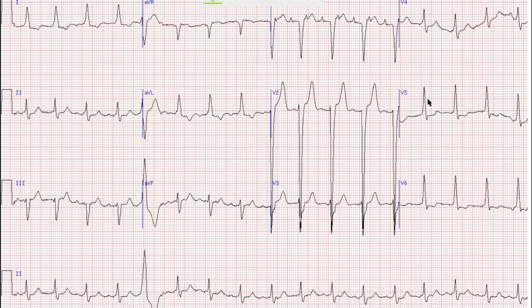As you know, the first thing which we look at on an ECG is rhythm. For rhythm, we look at lead 2 or rhythm strip. In lead 2 or rhythm strip, we can find upright P waves before QRS complex. So this is probably a sinus rhythm. Next is heart rate. We normally use a QRS complex which lies on broad vertical line, but in this case we cannot find a QRS complex which lies on broad vertical line. So we will use some other method.